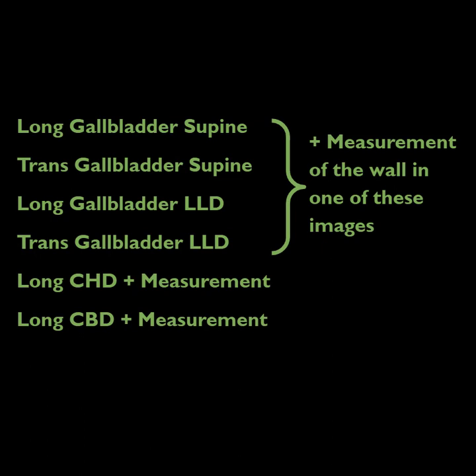You will want to use these images at a minimum. As a sonographer, you may choose to add more pictures in when necessary, or may be required to do so by your place of employment. However, wherever you go, these protocol images will serve as a good starting point.